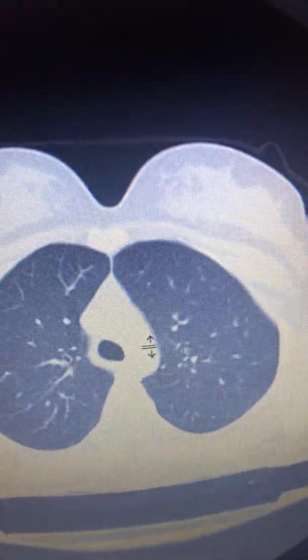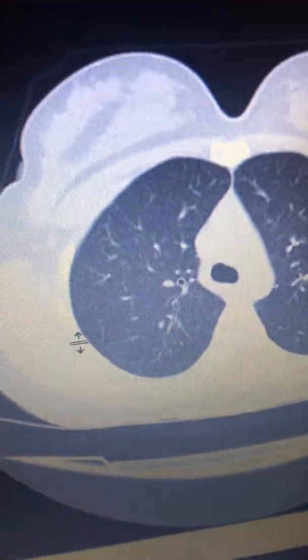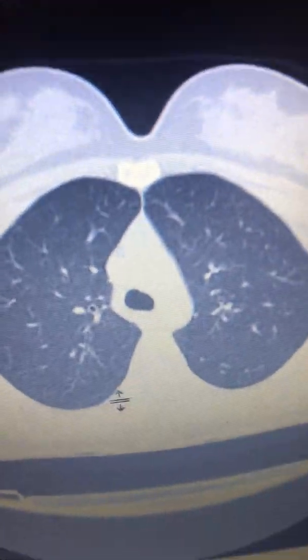The remaining parts of the body shine a lot more compared with the lungs themselves. Because we have to see all the lung tissues in detail, the remaining parts shine too much, so we are not able to evaluate the remaining parts of the body in these sections.